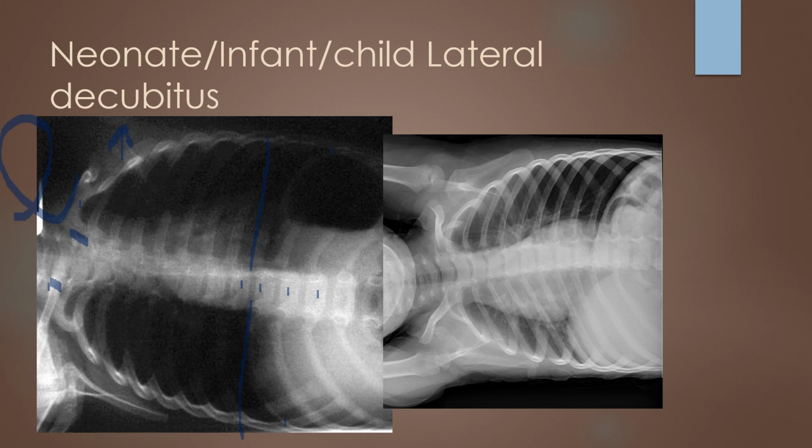We're going to go look then at a number of ribs, because this doesn't look like there's a great inspiration, but let's count to make sure. So I think we have rib 1, 2, 3, 4, 5, 6, 7, 8. Okay, so technically we have the 8 that we need. A little bit more like we see on this side would be nicer, but sometimes we have to deal with patient conditions. So it does not appear that there's a lot of mid-coronal tilt here.